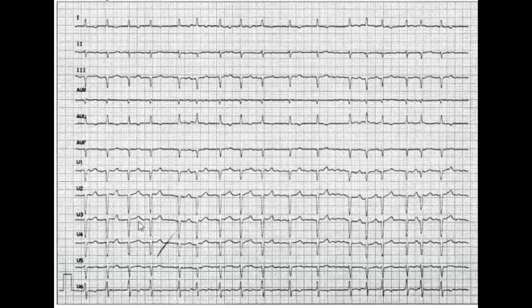Okay, one thing you need to know. So you checked the Sokolov's index. There is no hypertrophy. The QRS complex duration is normal. The only thing you see here is that there's left axis deviation not explained. If there's left axis deviation that is not explained, usually it means most of the time left anterior hemiblock. So left axis that is not explained by anything. There's no hypertrophy. There's nothing that can explain it. Not even like prolonged QRS complexes, which can be with left bundle branch block. Normal duration of QRS, normal Sokolov's index, then you can suspect left anterior hemiblock.